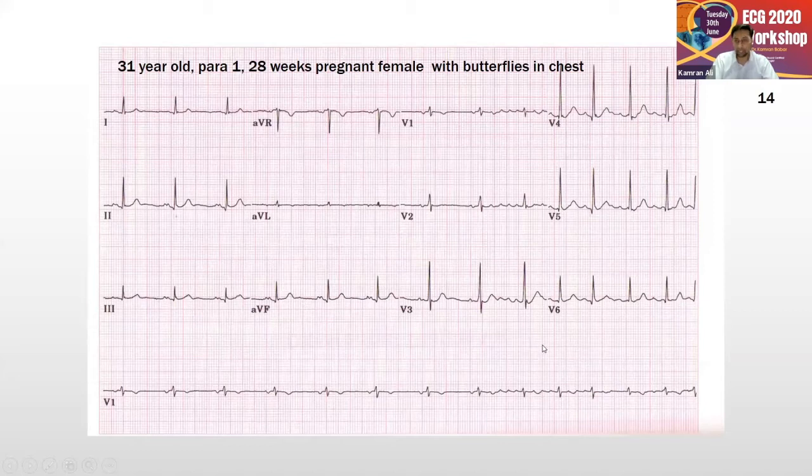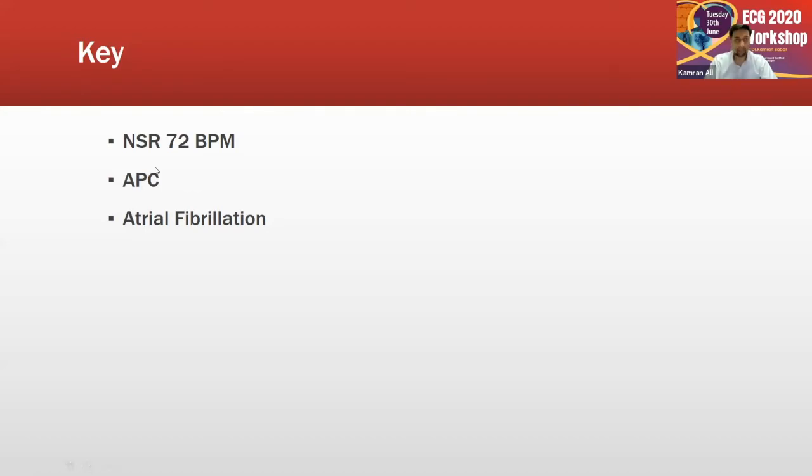In our clinical setting, when somebody with atrial fibrillation at such a young age comes in, we always think about rheumatic heart disease. Even though you might not be able to hear the diastolic murmur of mitral stenosis, you do an echo to check the chamber size of the left atrium. There should not be any mitral regurgitation or mitral stenosis or other findings associated with rheumatic heart disease responsible for atrial fibrillation in a patient like that.